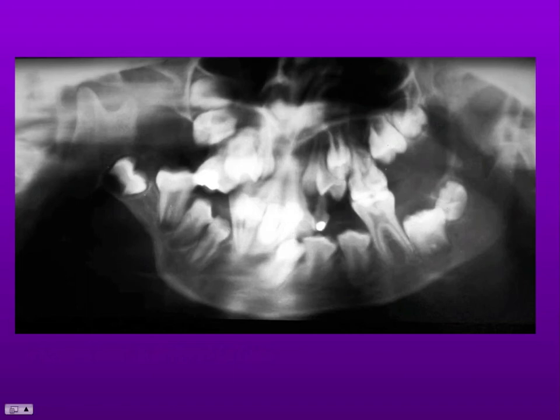Another jaw abnormality here. This is a patient who presented with a facial asymmetry, and in fact this child was born with the facial asymmetry, and it is really quite a dramatic one. It's so abnormal that it's really made it very difficult to take a decent panoramic radiograph. But what I hope you'll notice is that this side of the mandible is of normal size and shape, but this side is grossly abnormal, with a very small condyle, very small coronoid, a very short ramus, and this accentuated notch just anterior to the angle. This is called an antegonial notch, but very accentuated.